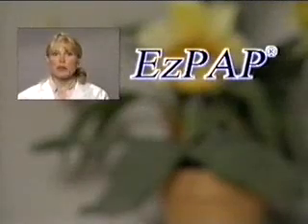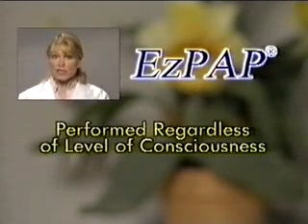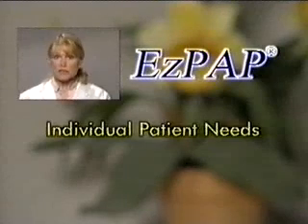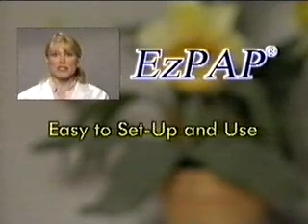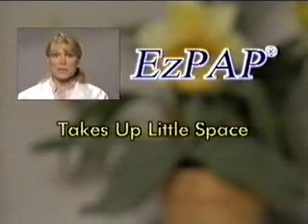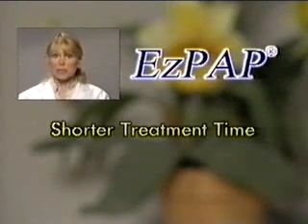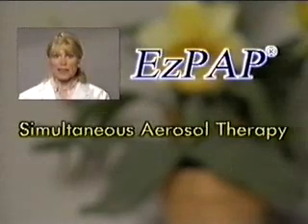Let's quickly review some of the benefits of EzPAP. It's easy to learn. It can be performed on all patients regardless of their level of consciousness. It can be adjusted to individual patient needs. It's inexpensive. It's easy to set up and use. It's small and takes up little space. It has a shorter treatment time than other therapies. It delivers simultaneous aerosol therapy.